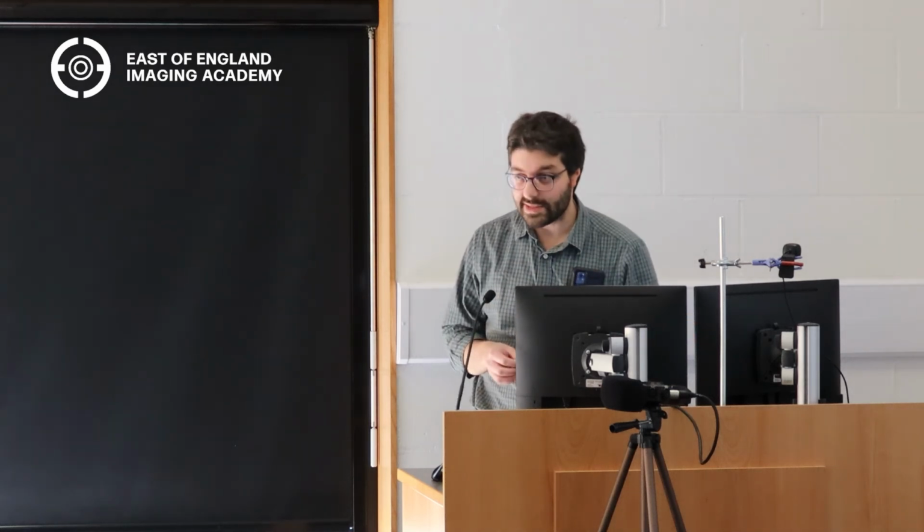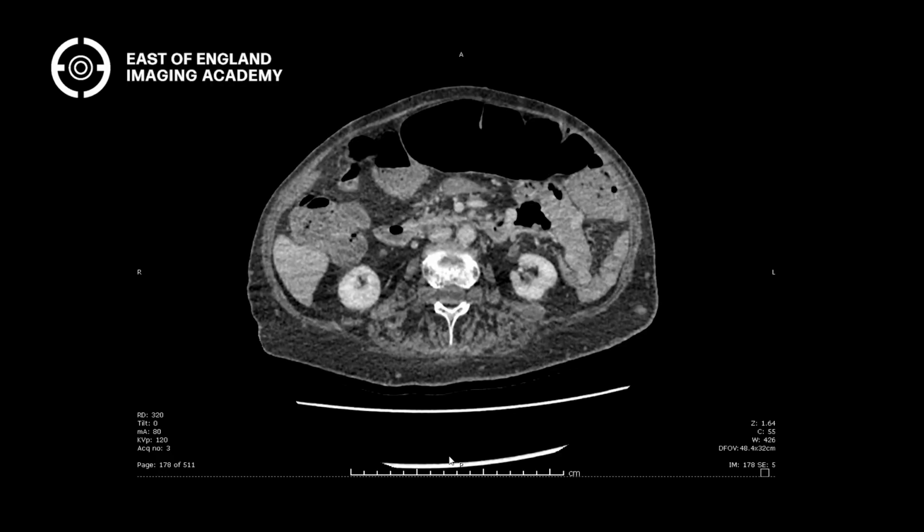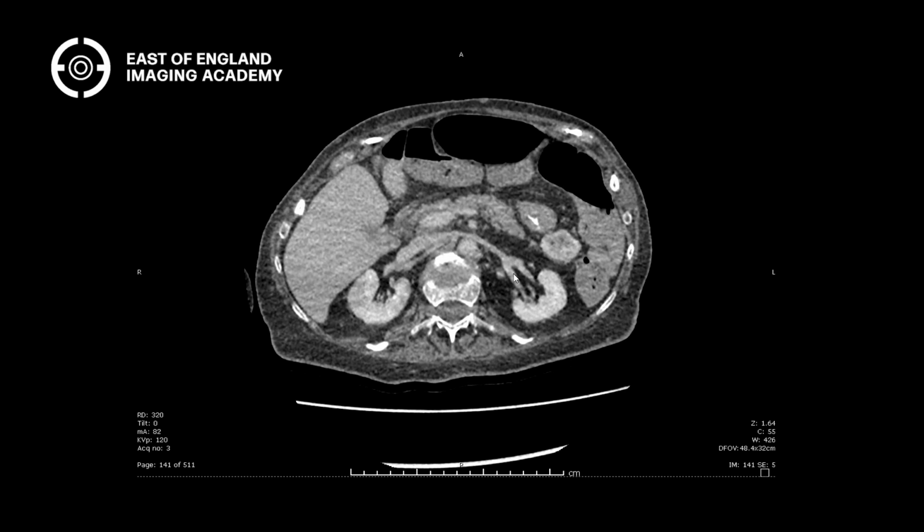In patients with NF1, these tend to be indolent and can be followed up. Usually, when they get over 3 centimeters, they cut them out. That's basically what they do. The only one here that's bigger than 3 centimeters is this one here, so that might be one they might consider cutting out. Does that make sense?